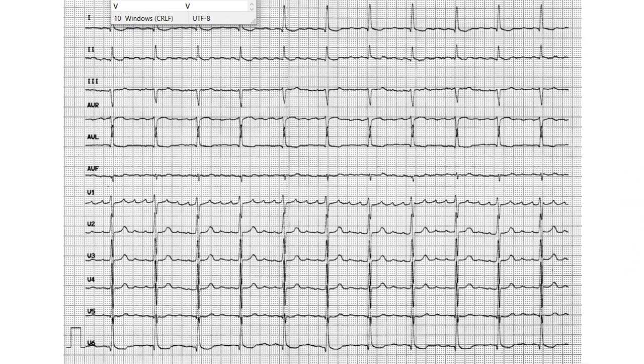So here, let's see if it's regular or not. Yeah, this is about this much. Regular, still irregular, regular, regular, regular, regular, regular, regular, regular, regular, regular. Yeah, so it's regular. So that is regular rhythm. Next point: that's point 1, it is regular. This is question 24.